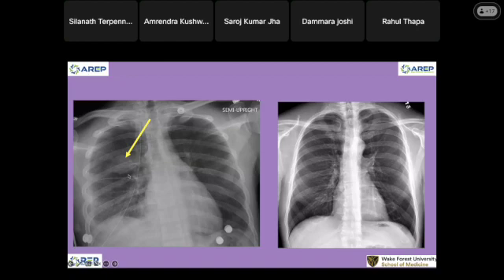Once you get trouble in one lobe, it looks like a tumor, but it's not. Actually, it's loculated fluid in the fissure between the two lobes. So the fissure is a barrier of infection; we call it pseudo-tumor. We can tell because the patient already has pleural fluid everywhere else. I'm just talking about lobar pneumonia seeping into the fissure.